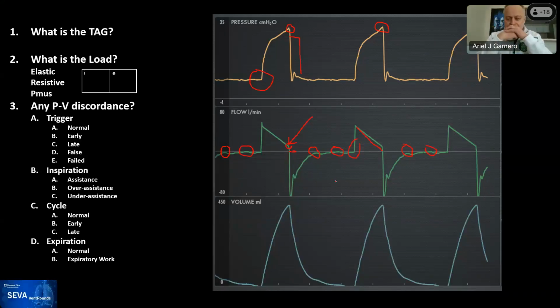Right. So we had a question from someone in the audience about this little notch right here. What's causing that? Well, you often see notches like that, and sometimes they're very big. Sometimes you see them look like that. And that's when you have a high load on the ventilator, either because of a very high resistance or a very low compliance, high elastance.